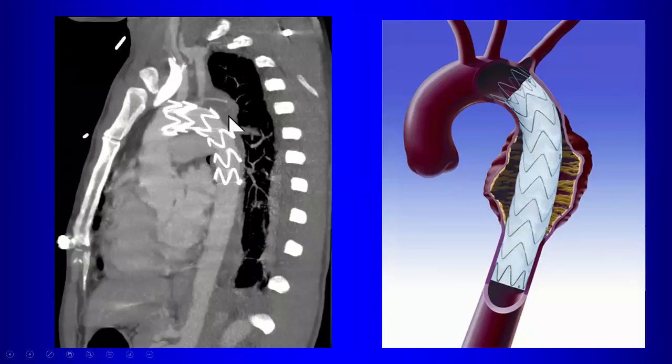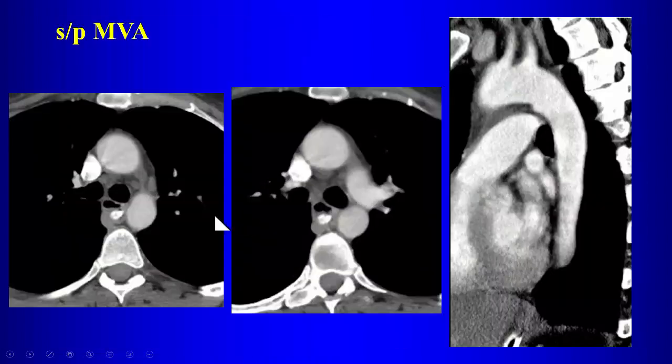So with these stents, the most proximal prongs are not covered. So those prongs can go over a vessel and will not occlude the vessel. Okay? So don't make the mistake of saying that, oh, the stent graft is covering the carotid artery, right? The proximal prongs are usually not covered, so they can place that over a vessel and it will not occlude the vessel. Okay?